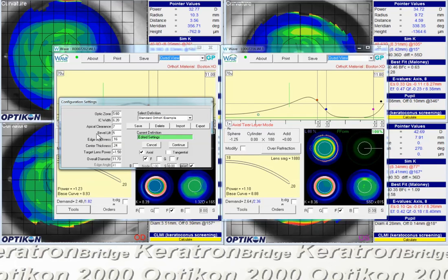All right, so I'm going to let this run, pause the video in the meantime. Sorry, I had this box checked. There's actually an R that's cut off on my screen here. This should be the box you're checking. That's the freeform.